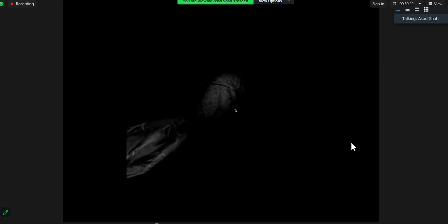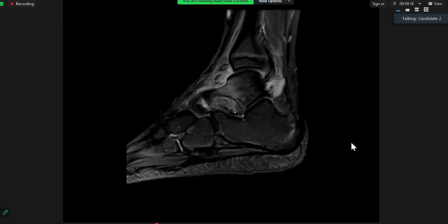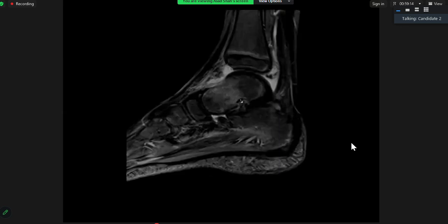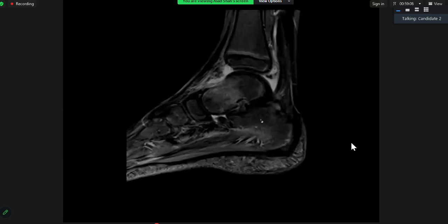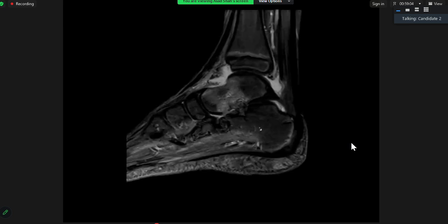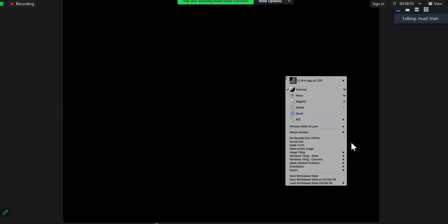So this is a non-contrast sagittal STIR. It is showing the joint effusion, a moderate amount of joint effusion, and abnormal high signal intensity areas involving the talus. The X-ray also was showing relatively reduced bone density. So again, I can put the differential of septic arthritis and juvenile idiopathic arthritis. Okay, let's look at that image. All right, sorry. Okay, I've ruined it a bit.